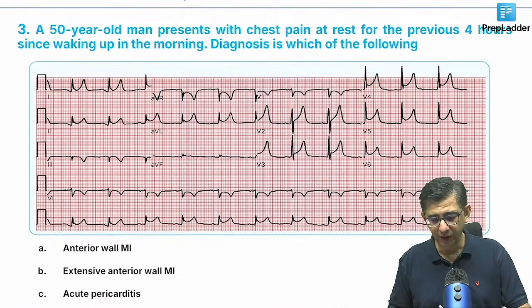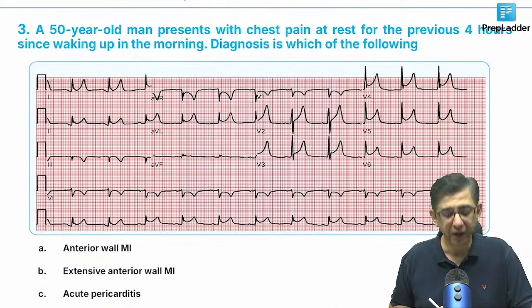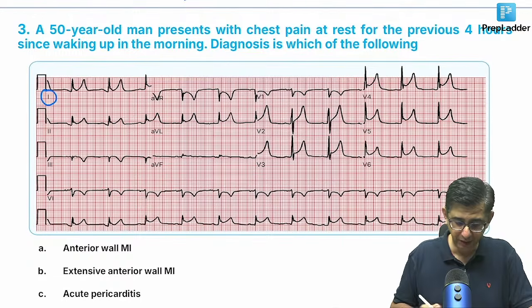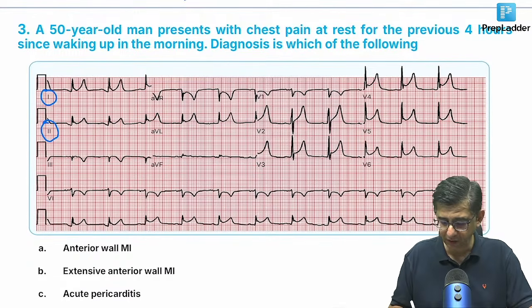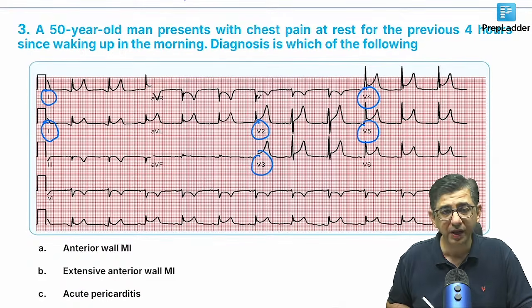Moving to the third one, a patient comes to me with chest pain for the previous 4 hours since waking up in the morning. And then we can find these very, very characteristic ST segment changes in lead number 1. I can see it in lead number 2 also. Then you can notice that even in V2, in V3, V4, even in V5, we are having these ST segment changes.